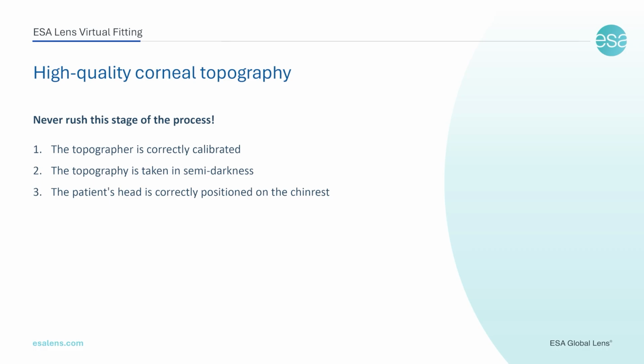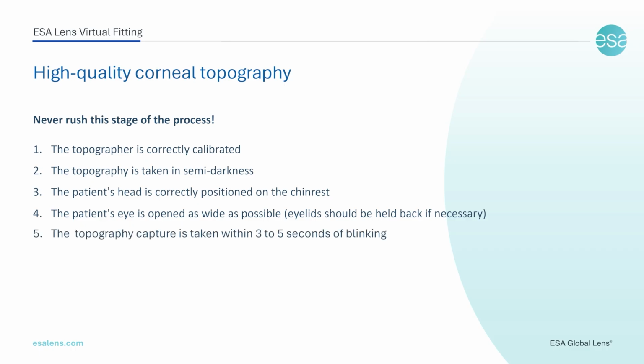3. The patient's head is correctly positioned on the chin rest. 4. The patient's eyes opened as wide as possible. Eyelids should be held back if necessary to reveal the entire corneal surface and limbal area. 5. The topography capture is taken within 3 to 5 seconds of blinking.